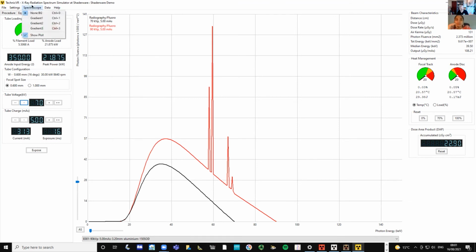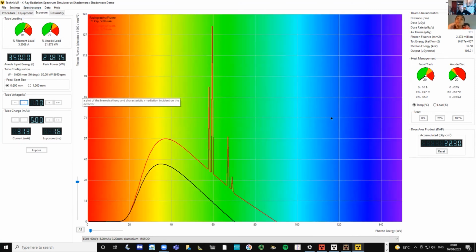We even have a color code, because I think students understand how light is a mixture of different colors quite well, you know, the rainbow and everything. So we can put a gradient along the back saying if this was light, the low energy light would be red, the middle energy light would be green, and the high energy light would be blue.